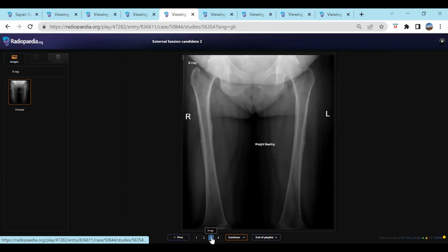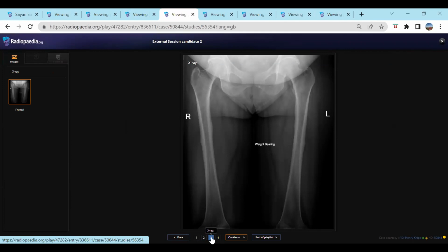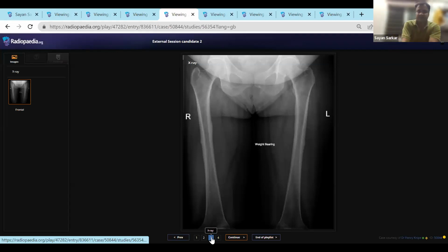Okay, so I've been provided with X-rays of the bilateral femora, and I see that there is increased cortical thickening bilaterally. Yes. And again, it's bilateral symmetrical. Absolutely. It could be related to underlying osteoid osteomas, which is what I find confusing about this. Yeah, it can be, but they are symmetrical, and the patient is a case of breast cancer with multiple bone mets, as you yourself told. Do you think anything related to those things is coming to your mind?